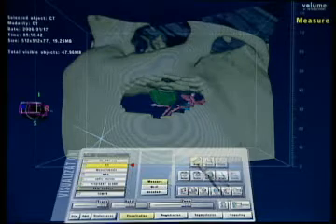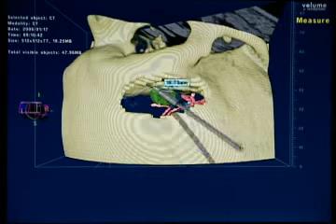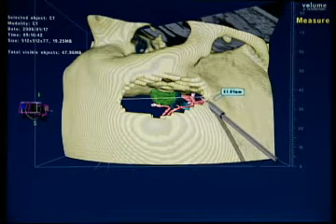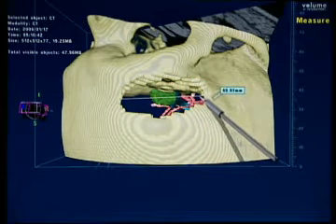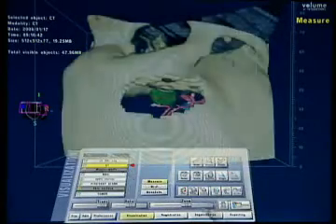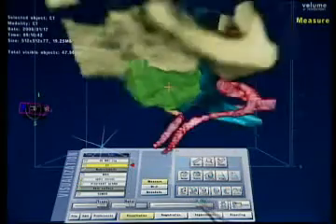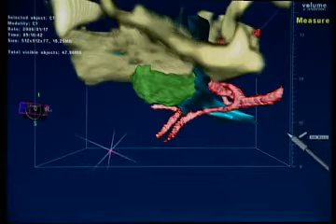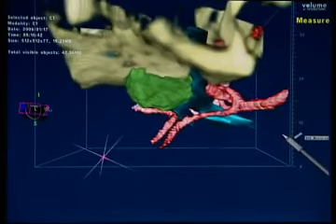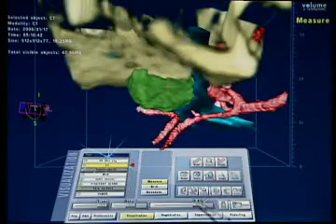Being there somewhere. I can do a measurement, by the way, just to demonstrate that. From here to there, it's 40 millimeters. We did a smaller craniotomy in that case, but it doesn't really matter now for the sake of demonstrating that. And now I'm coming in. So that would be the way, pretty much very accurately, the way we were encountering this lesion during the approach.